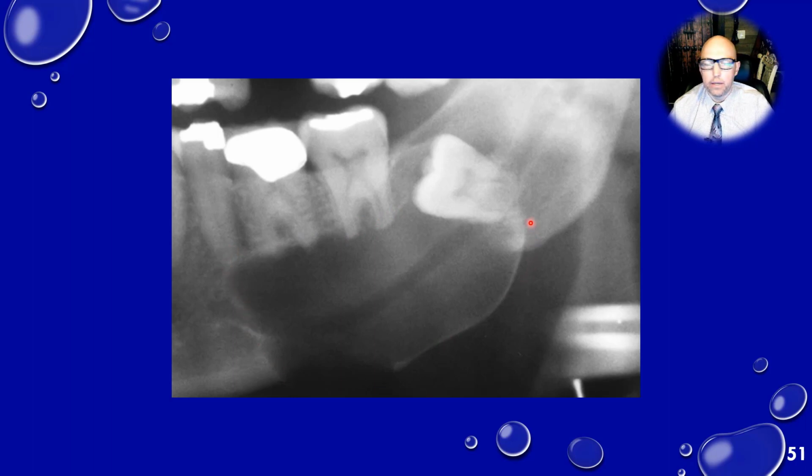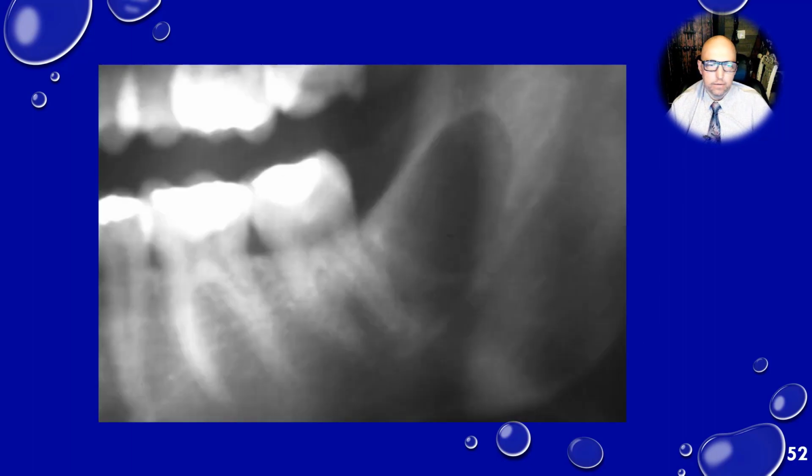This one does happen to be a dentigerous cyst. So when it is associated with an impacted tooth, even if you have OKC, because you see that attachment further down on the root than at the CEJ, remember to have dentigerous cyst. In fact, one of my acronyms to remember is DOA: Dentigerous cyst, OKC, Ameloblastoma, when you see these unilocular radiolucent lesions in the jaws. So if it's associated with an impacted tooth, DC, dentigerous, should be on your differential. But I would probably not even have it first in that case.